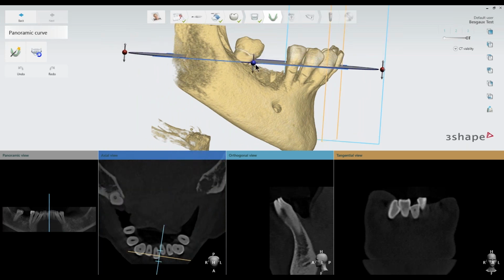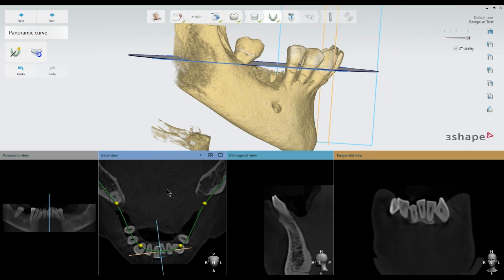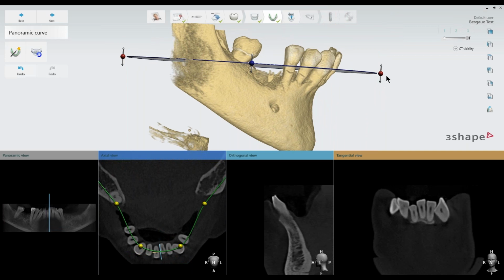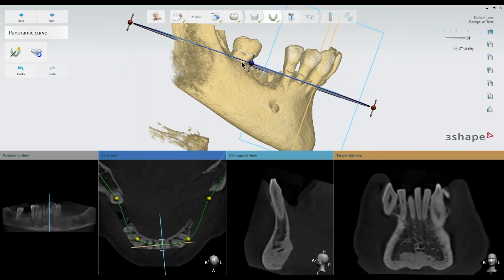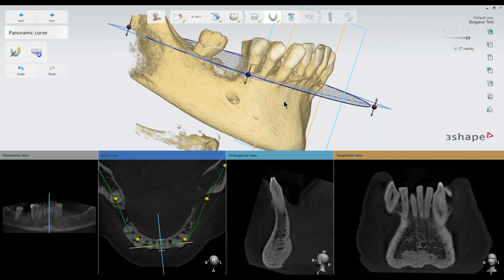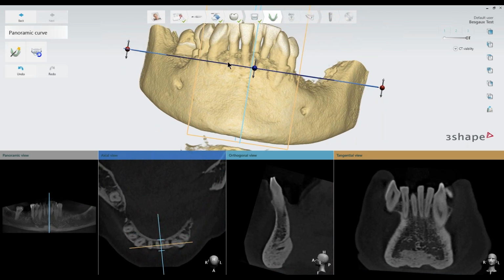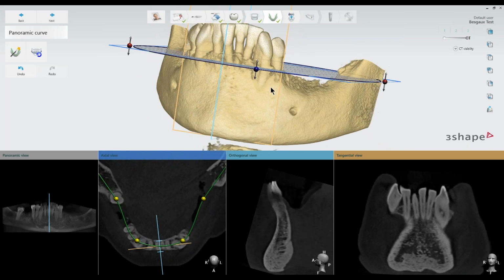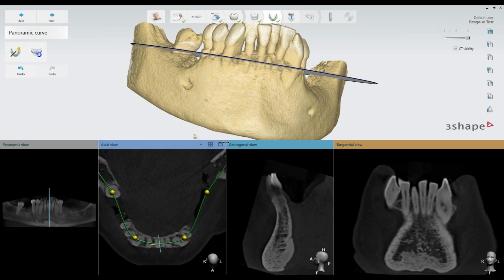Starting off, I want to move around this plane, which is setting up this axial view window. Ideally, I want this to be mostly parallel with the jaw, kind of cutting through just where the teeth crest from the bone. So I'll just double check from a couple angles, adjusting my rotation, raising or lowering as needed. And then I'll focus in this axial window.